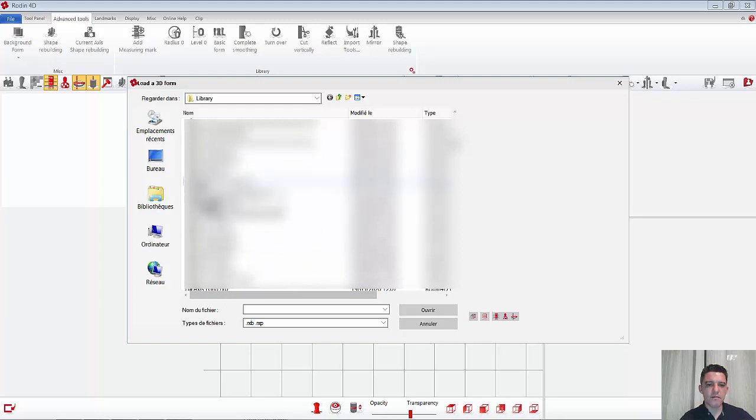You can see that in my library, I have many axes, because if you need to bend in different steps, different directions, something like this, and you feel that you will repeat in the future, it's much better when you modify everything to save like a new template, curve axis for CAFO, for HCAFO, for everything, no? But in a real case, probably you have only one, so I want to show you.